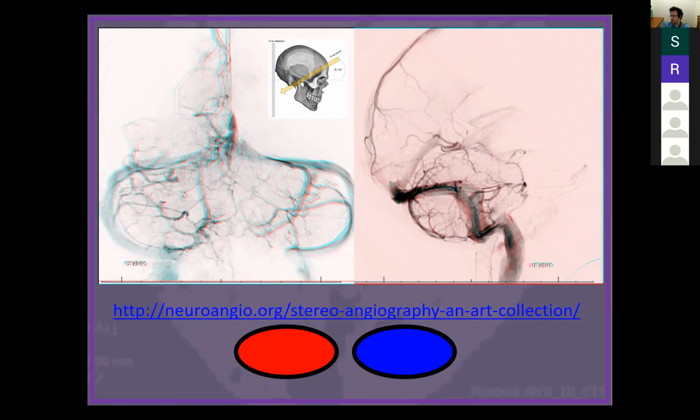There's the mouse. So you can imagine the quadrigeminal plate is going to be sitting somewhere here. The lateral mesencephalic vein, which is very faint here, but that's this structure here. So that would be sitting where the lateral mesencephalic vein sits. And then finally, over here, you have these veins.